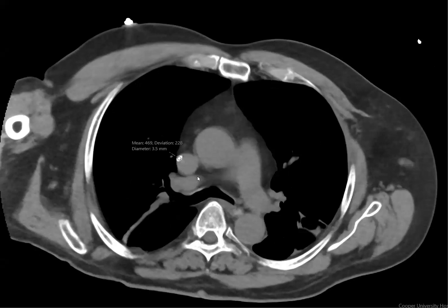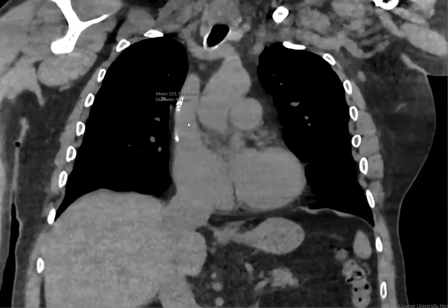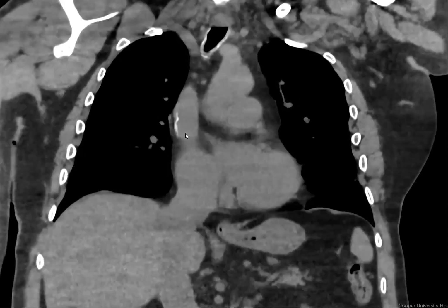And why is there a linear calcification exactly at the same location where there was a cardiac lead? So what happens is when the patient has these catheters or leads in the vein for a long time, there can be fibrin sheath deposition along the flow of the blood. So the blood flows along these leads, and there's a normal expected fibrin sheath that deposits.